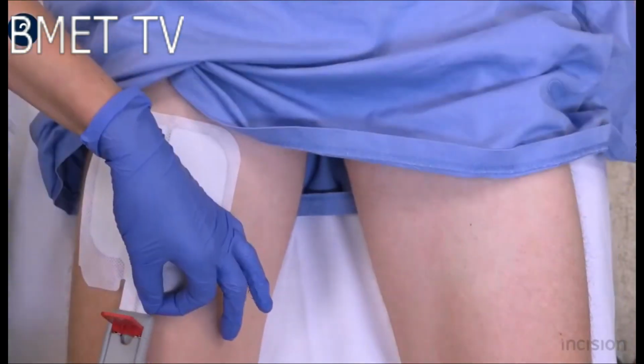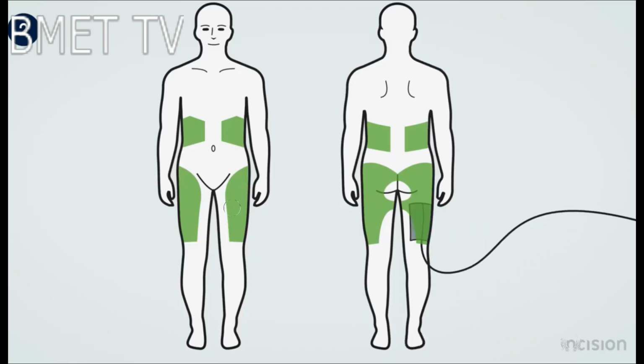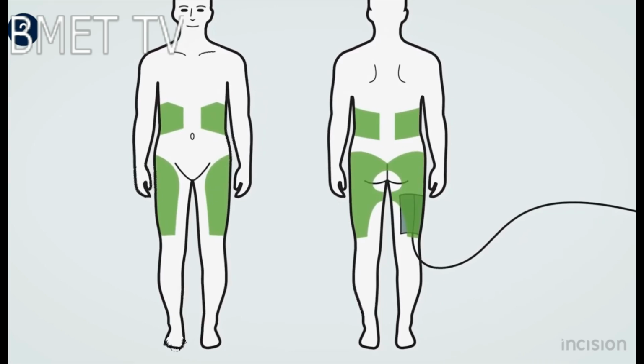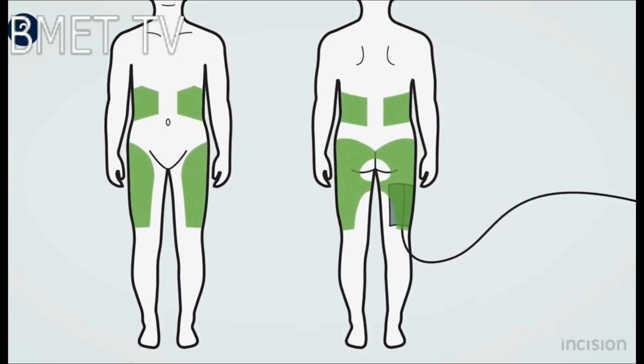Although cost-effective and versatile, disposable grounding pads can cause patient skin problems such as hypersensitivities, allergies, and even removal of layers of skin when the pad is removed. Additionally, many practitioners are concerned with the wastefulness of disposable pads. Advanced technology has introduced the reusable pad that reduces and in most cases eliminates the negative results of using disposables.